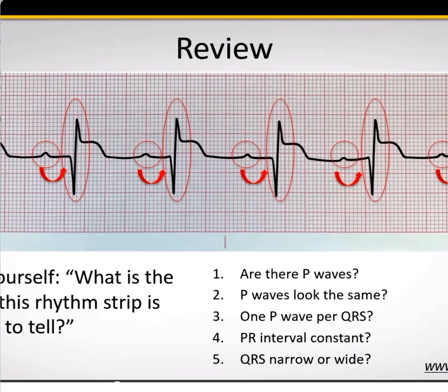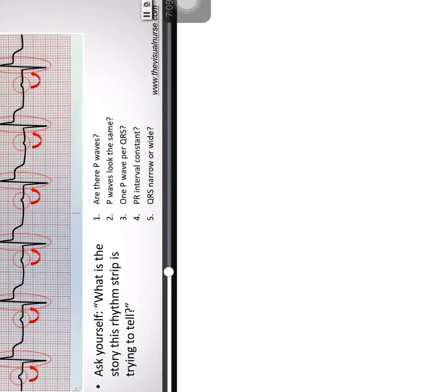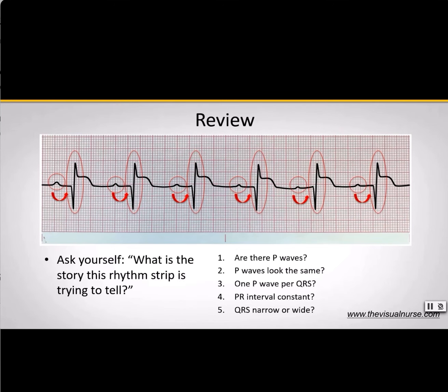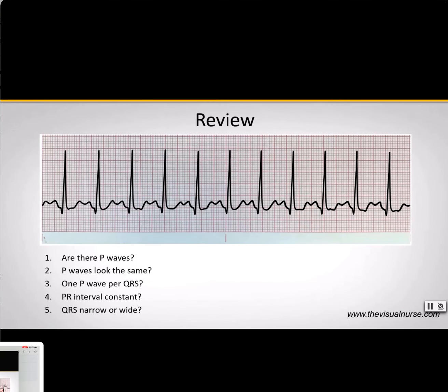Myocardial infarction. This is an absolute medical emergency. If you see this, assess your patient, report it right away. Okay. Next up, let's go ahead and work through this rhythm strip together here.